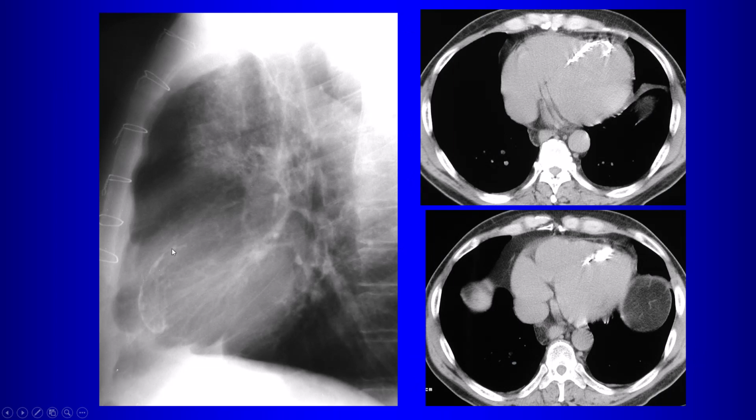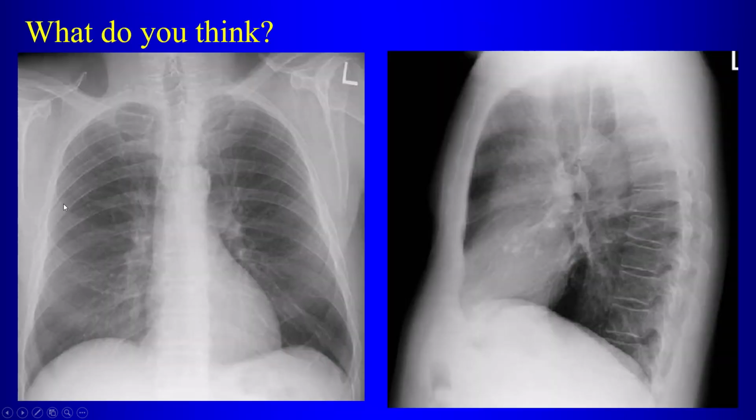Here's another example of myocardial calcification. This is located along the interventricular septum here. Again, this is secondary to an infarct in the distribution of the LAD. Now in this example, we have a normal sized heart. On the lateral view though, we notice calcifications here right in the middle of the heart.